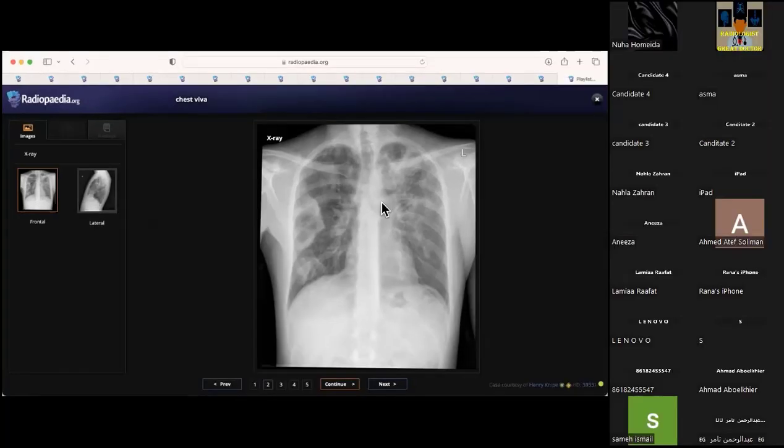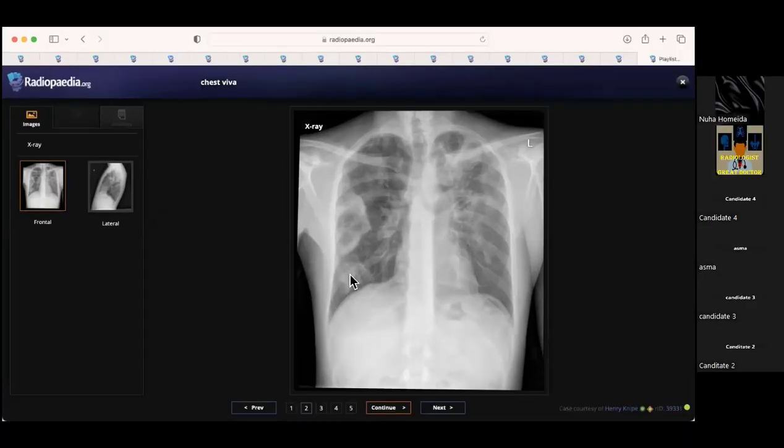Yes. So you've picked up the distribution nicely, and all these changes. Is there any one unifying pathology that you can think of that gives you peripheral airspace opacities in a young patient with chronic history?